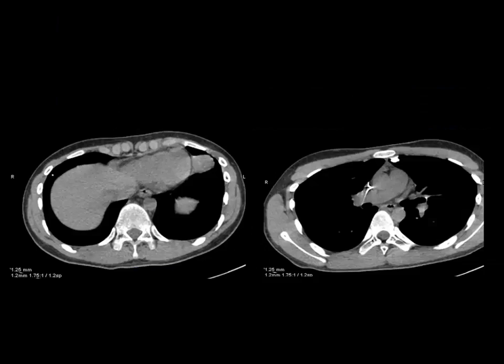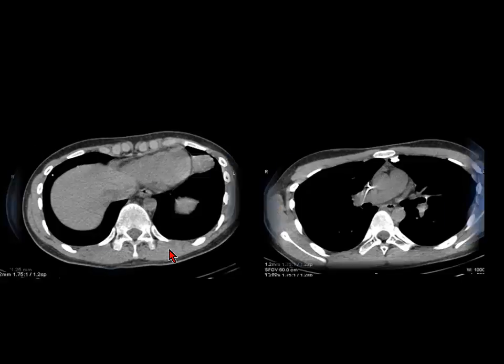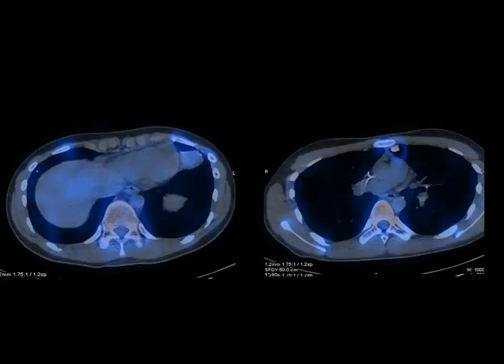Again, stressing on the images, look at the lung windows. If you have done the SPECT, there is a mass in the left lower lobe. If you fuse it, there is no uptake and there is pleural calcification, probably granuloma or pleural plaque, and that's the granuloma there.